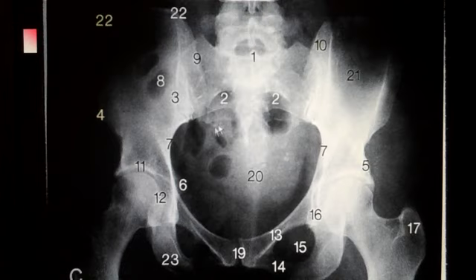Now the reason that the sacrum gets kind of fuzzy looking right here, not clearly visible, is because that sacrum is sitting at such an angle, and we are taking this view straight on A to P. This film is taken A to P, and it is read P to A. You would expect to find the nameplate in the upper left-hand corner or the lower right-hand corner. That concludes this video.